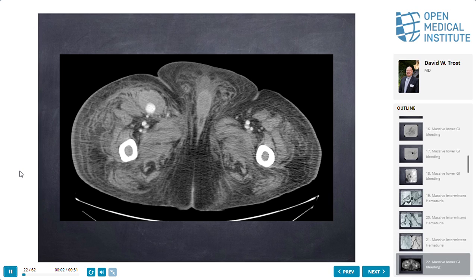All right, sometimes we cause our own problems, or even better yet, it's cardiology's problem and we have to fix it. So what's going on here? What's happening in this groin? Pseudoaneurysm from the puncture, from an arteriogram. So you see these, usually they're diagnosed because you get a big hematoma and you get an ultrasound, and you'll see it with an ultrasound.